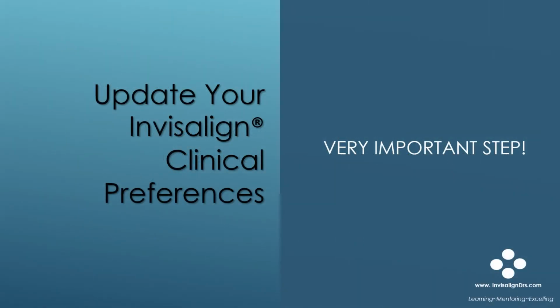It is important to update your clinical preferences periodically. These preferences are applied to every case by the technician group that develops your treatment plan. Updating your preferences will simplify the ClinCheck development process. You can override these preferences once you start developing a ClinCheck.